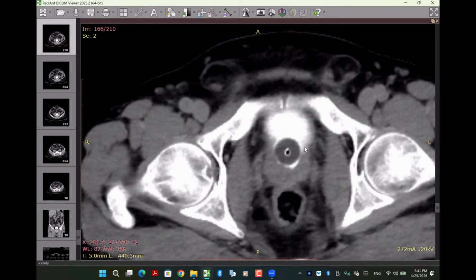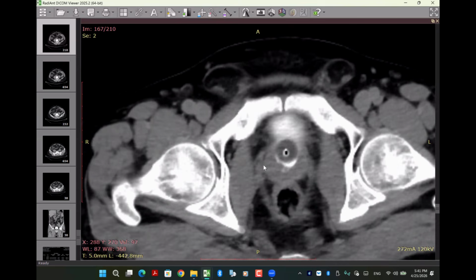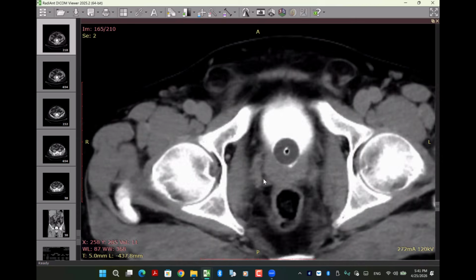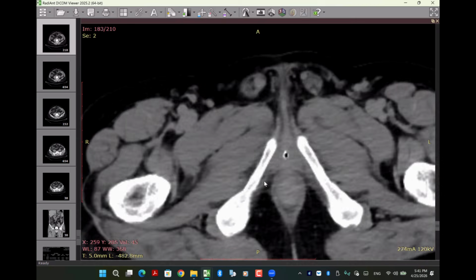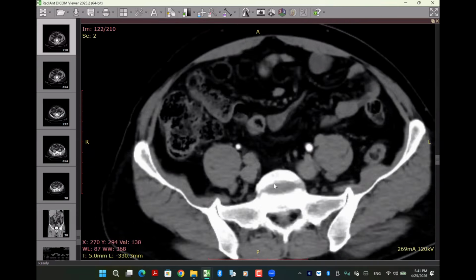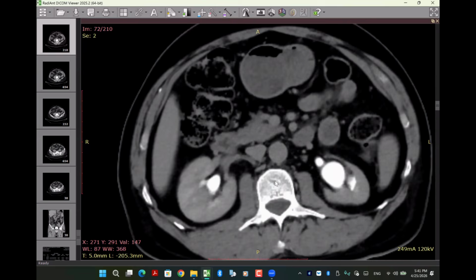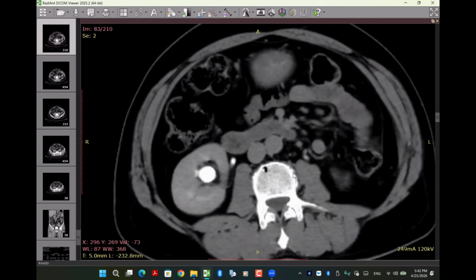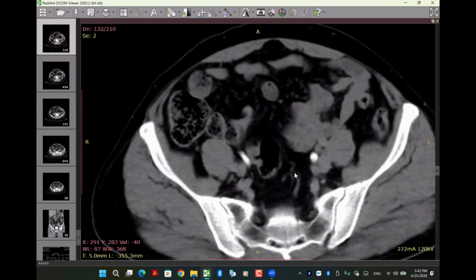Or this is post intervention inside the bladder. Yeah, some extravasation of the contrast is seen. Okay. Let me give you a clue for this case. The moment you deal with any case of hematuria, you should go straight forward for 2 scans, the nephrographic phase and the delayed image. Don't close your study without the delayed image.